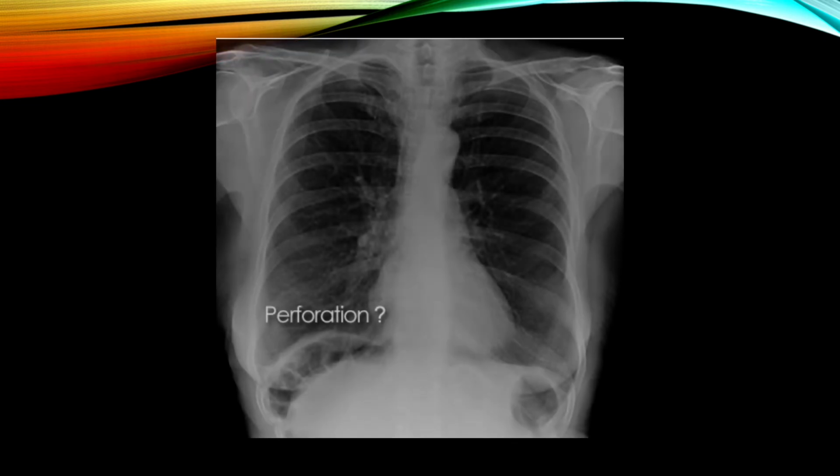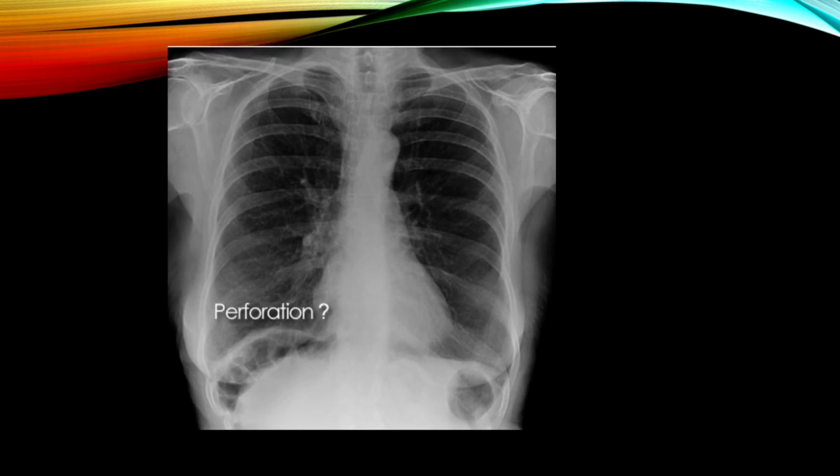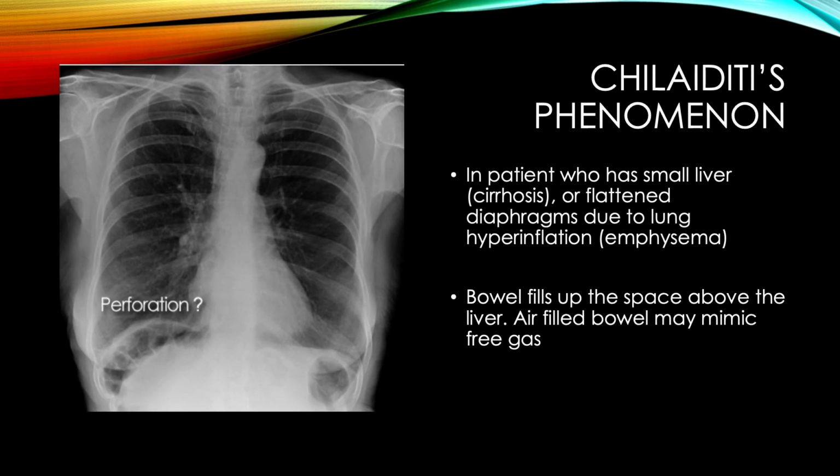Look at this X-ray. Is this perforation? This is pseudopneumoperitoneum, known as the Chilaiditi phenomenon. It refers to the interposition of the bowel between the liver and the diaphragm. An air-filled bowel may mimic free gas.